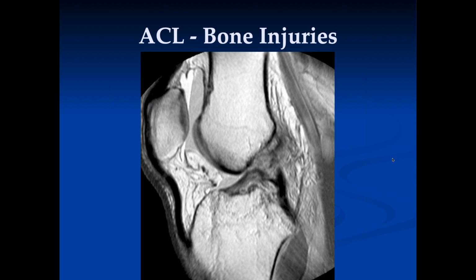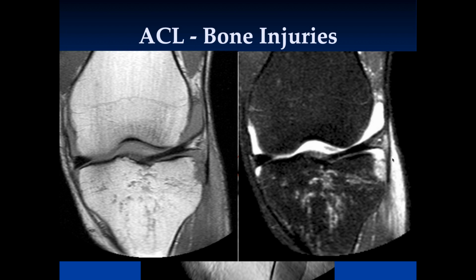So here we can see an acute tear of the mid ACL, and there's a fluid level in the joint space compatible with hemarthrosis. Okay, it looks like there's also an oblique fracture of the tibial plateau with some mild impaction. What is this? Is it a Segond fracture?